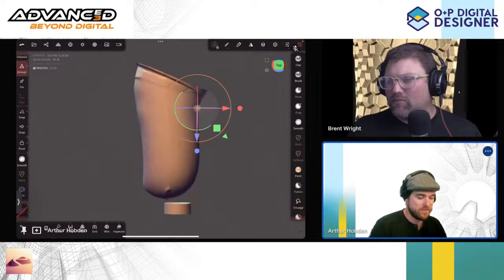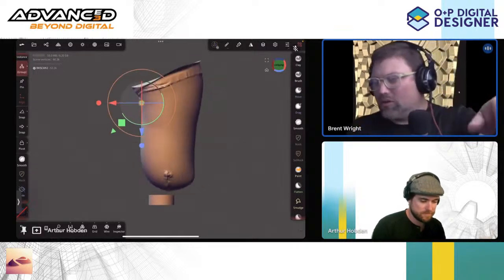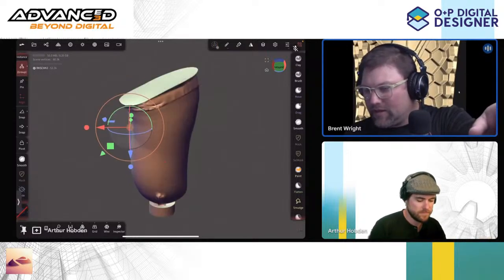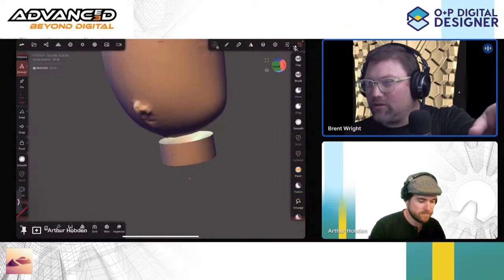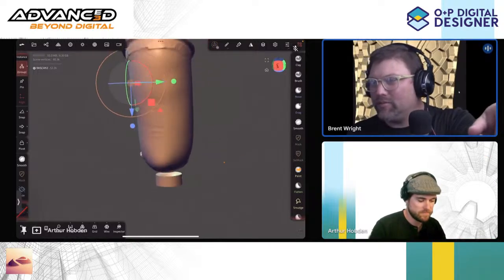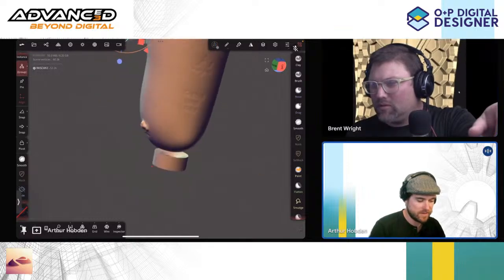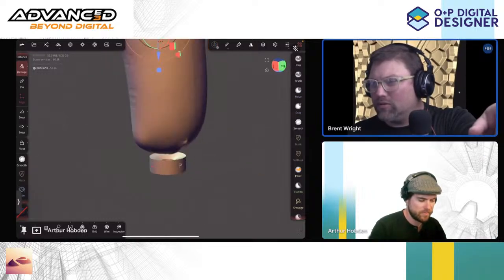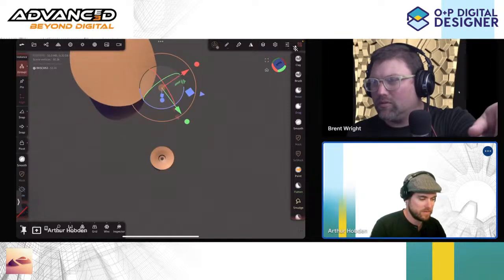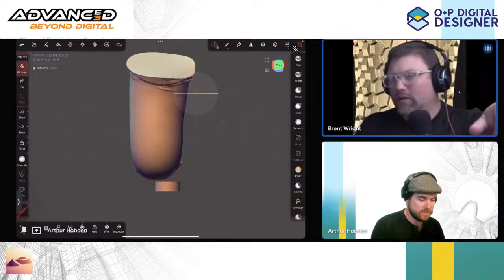So how far off do you like your bulldogs from the distal end? If you look at the bulldog, there's an A and a P. That's to help line up anterior posterior. I think I got that correct. No, posterior is back. You're right. Let's align that. We'll look at it from the back side. Try and get that right.